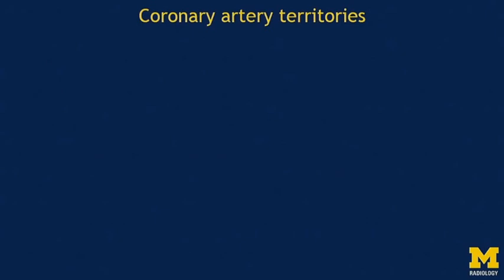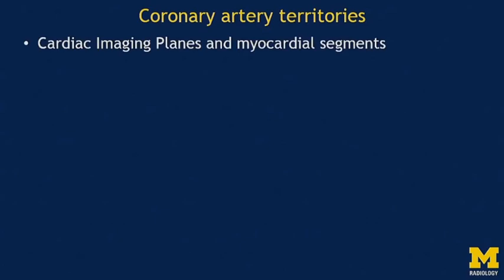Let's move on to coronary artery territories. Once we've talked about the normal anatomy, I want to discuss a little bit about the territories, about how you set up the planes, and the various cardiac planes themselves.